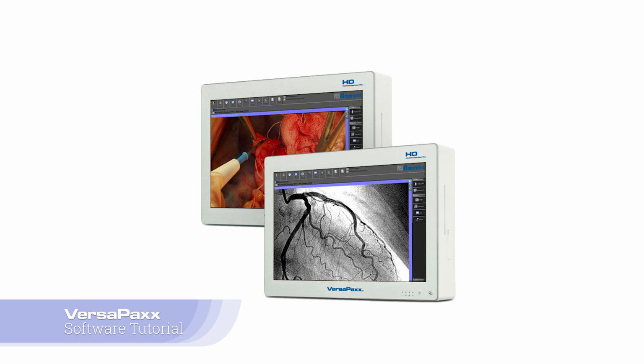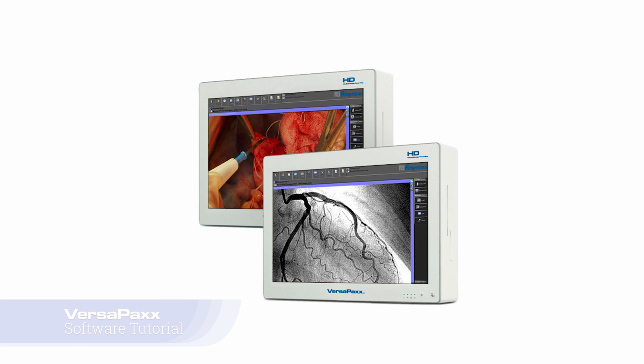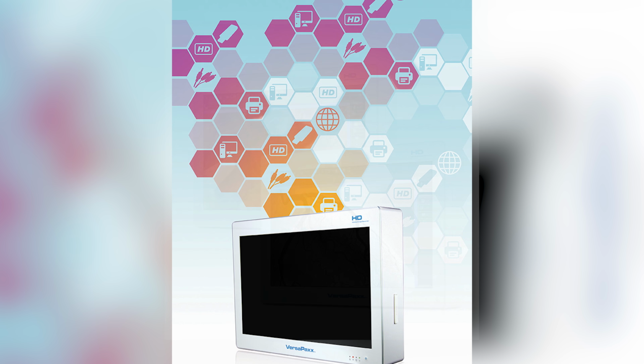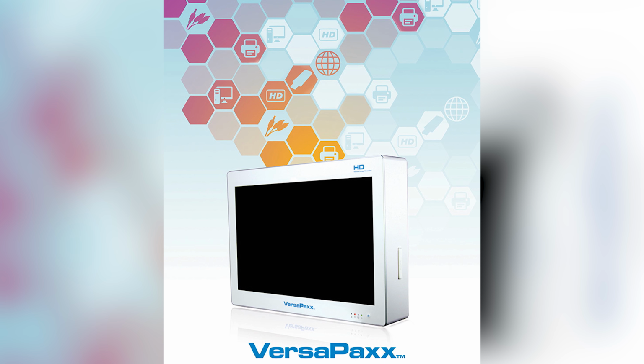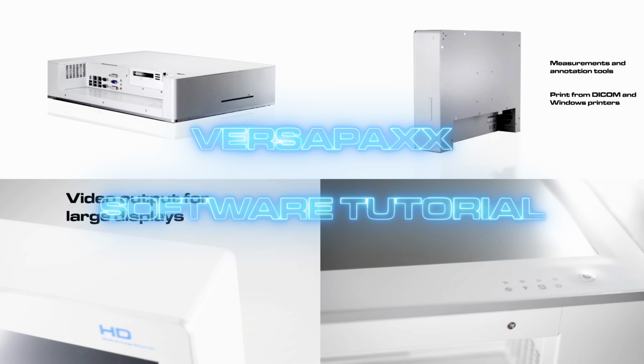The only one of its kind, VersaPaxx is a 22-inch, all-in-one touchscreen video recording device with advanced analytical and diagnostic tools. The VersaPaxx allows you to effortlessly capture, analyze, and transfer video from any modality and upscale it to HD.